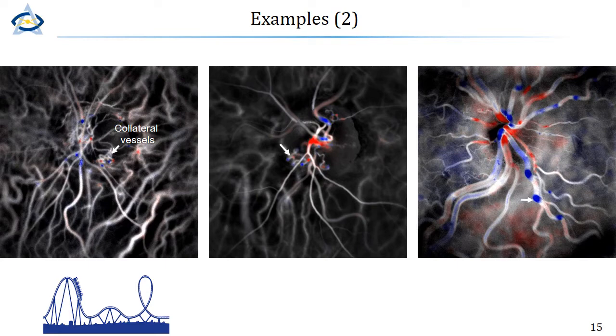And in this other example, you can see that the vessels tend to be sort of designed in a stairway fashion. So it amounts to the axial tortuosity of the vessel. It's really what you can visualize with this directional contrast.